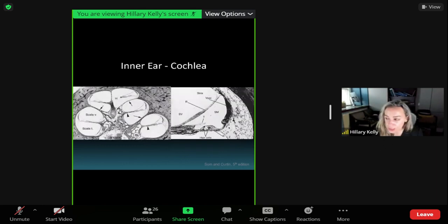In the center here, you have two little dots. This is a normal structure. It's called the subarcuate artery passing through the ring of the superior canal. Sometimes when you're looking at this or scrolling through in the other planes, people can think that they're a fracture. This is a normal structure. It's called the subarcuate artery and vein. All right, it's right there. That is not a fracture. That's a normal structure. All right.